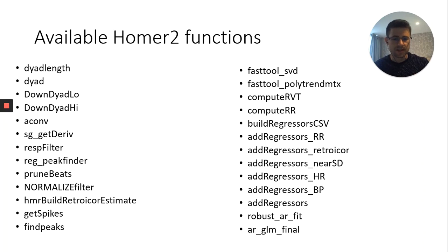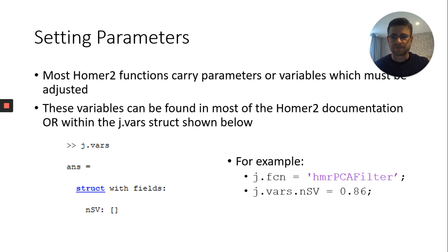So we'll continue through. Again, if you see anything, you're welcome to screenshot, save it as a JPEG, and go through them yourselves. And I'm going to try to go through each of these over time. So you should have a video eventually of each of these. Okay, so that was each of the functions that you could actually potentially call.